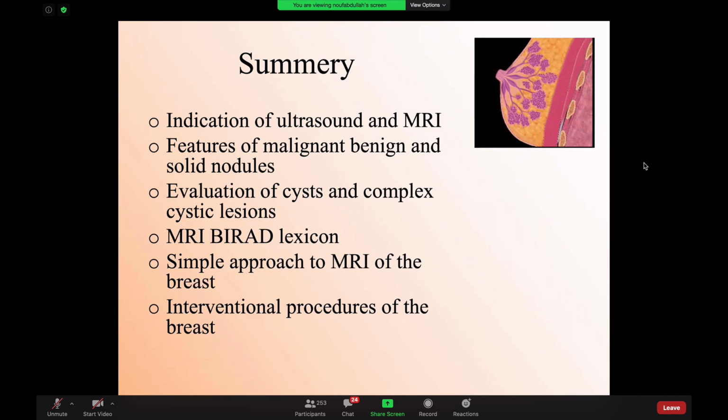In cases of mastitis or abscess, you will see a very irregular shape collection. You will find that the fat is echogenic. You will find overlying skin thickening. In some cases, there is overlap between the galactocele and abscess. I do agree that sometimes it's very difficult to differentiate.